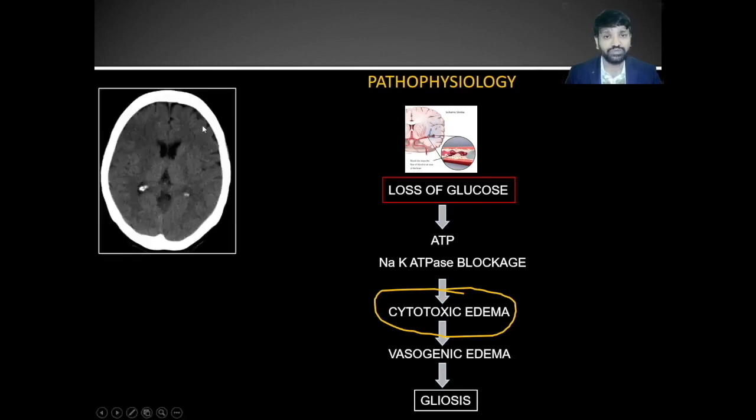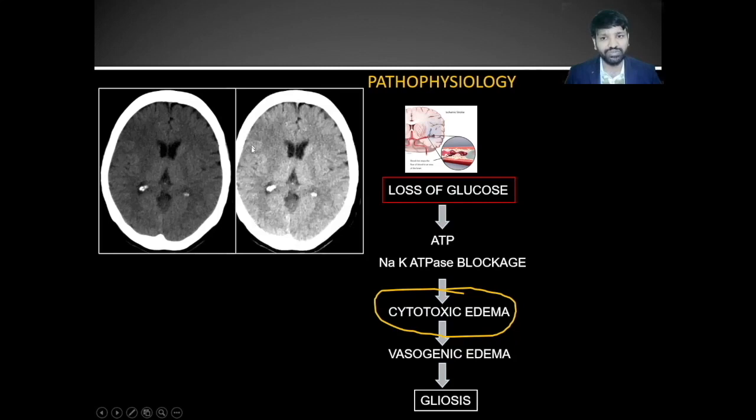That is why when you're suspecting a stroke case, it is always better to combine the CT images with CT angiogram images. So when you're looking at the thick sections of the CT, always try to make out the normal gray white matter junction. If you're not able to appreciate the normal gray white matter junction, try to adjust the window settings so that you'll be able to appreciate the contrast between the gray matter and white matter in a better way. For example, the loss of gray white matter junction differentiation here is better appreciated by adjusting the window settings.